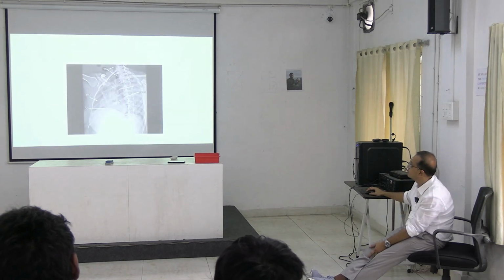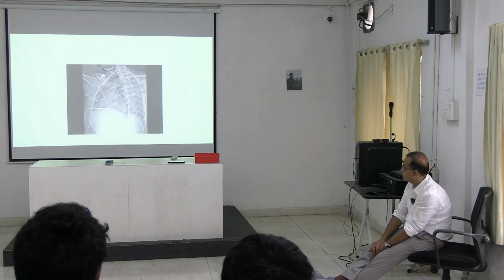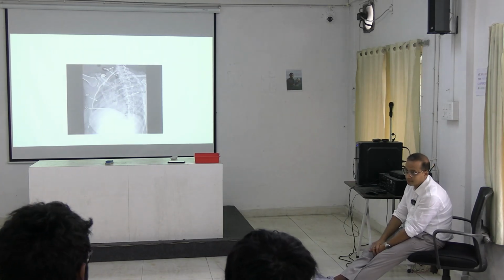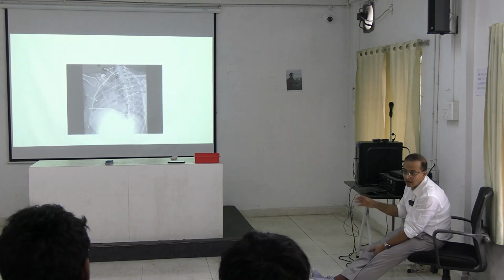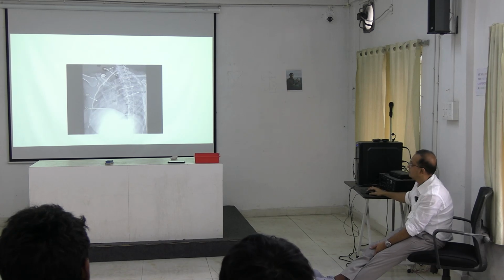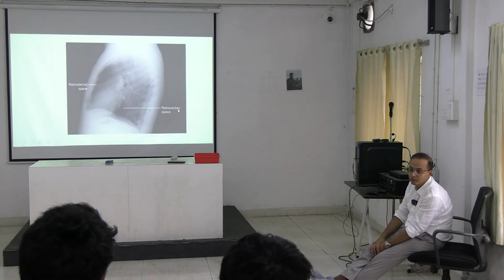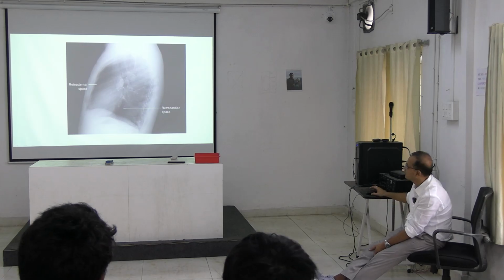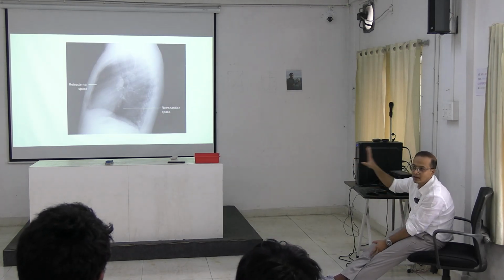Now, this view you are seeing here, what kind of view will it be? It's a lateral view, a classical lateral view. Do you see that? No, it's not a classical lateral view. It's a little bit oblique. This one is the classical lateral view. It's a straight lateral, all the way lateral. The person is standing and this picture is taken all the way lateral.